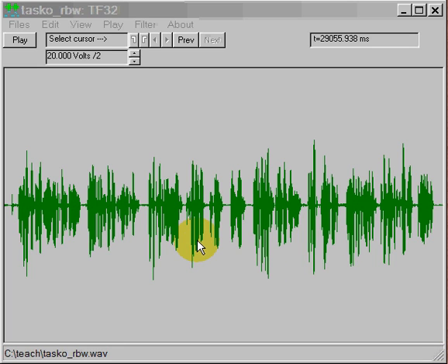Hello, this video tutorial is put together to help you make measures of speaking fundamental frequency for your voice diagnostic experience. Make sure that you've reviewed the introductory videos so you know how to use the basic functions of the TF32 tool. In order to do this analysis, you need to open up one of two files. One is the file of the oral reading passage, and the other file, which you can do once you've done the analysis on the oral reading passage, is the picture description file.